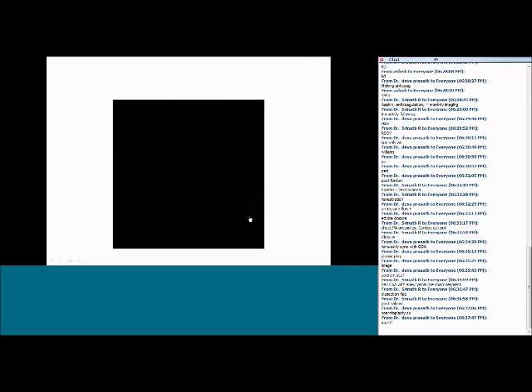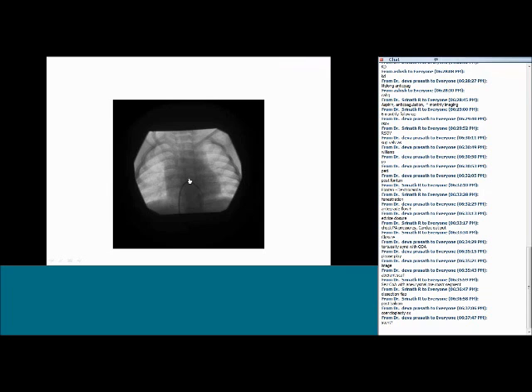Okay, diagnosis. Next patient. No, this is a small child. Why will you put a stent? This is a small child. You can see by the angio itself that this is a small child. Yeah, covered stent is an option in the previous patient, provided the patient is grown enough. Otherwise, please send this patient for surgery. Okay, diagnosis in this patient, in this angio and the next one.